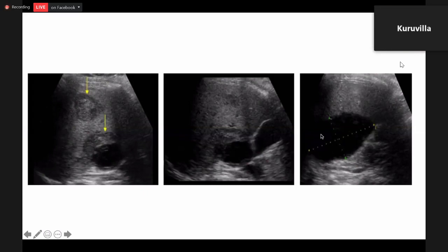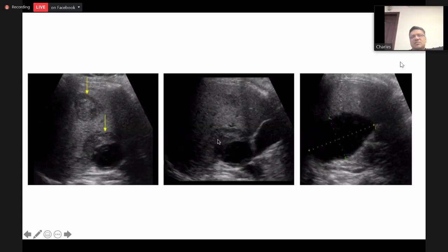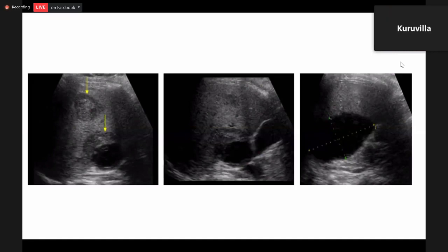And you can see that there is a large perihepatic hematoma here. So you're seeing two heteroechoic lesions, and in one of the lesions you're seeing a large hematoma, and you're seeing perihepatic hematomas. And probably, as you said, the patient is a bodybuilder, maybe on anabolic steroids, likely to be hepatocellular adenomas. Adenomas are known to have spontaneous bleeds and rupture.